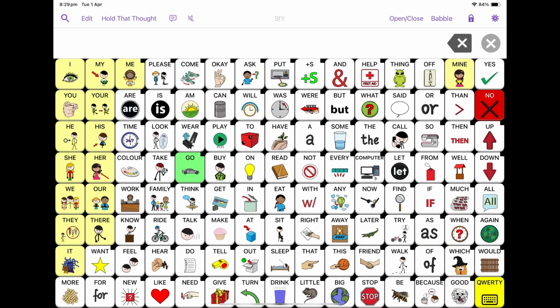There is no setting to change what is spoken, but there is an option to mute while you compose the message.